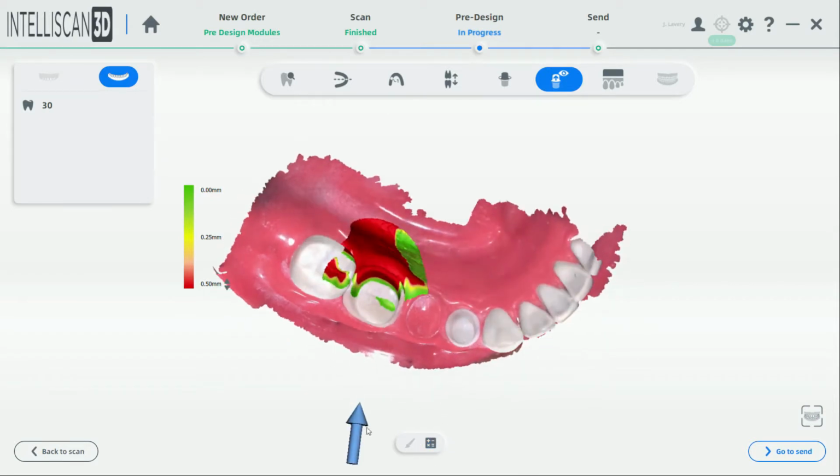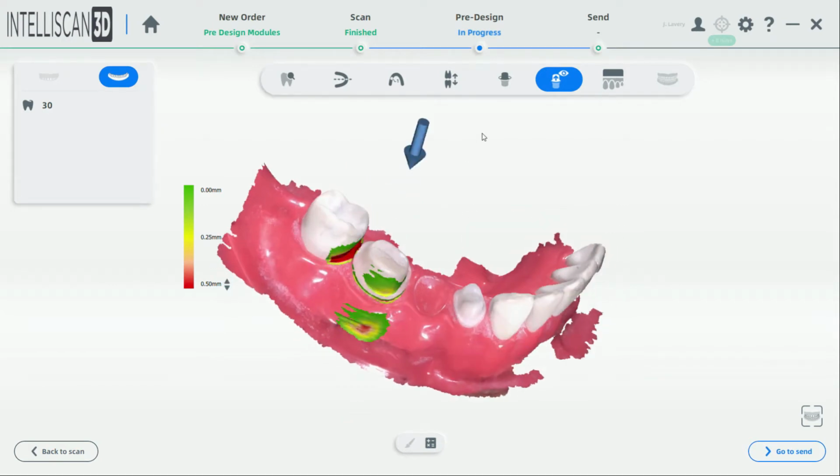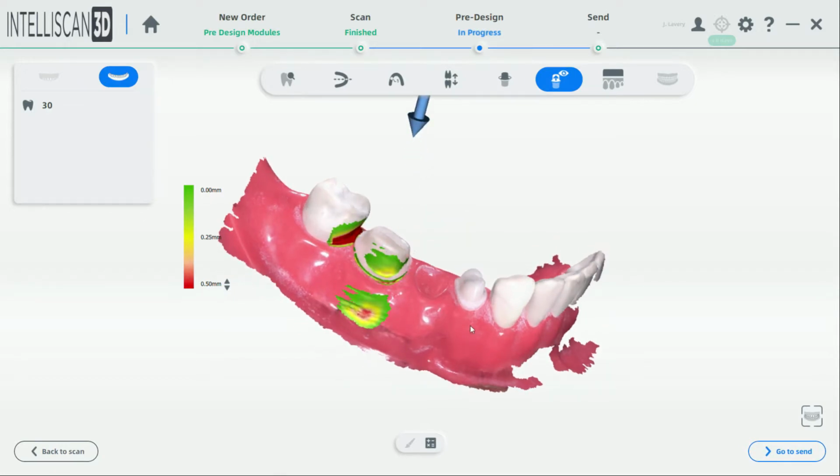but you do want to make sure that you double click right on the occlusal to position your pin directly from the occlusal. And as a reminder, if you do have to adjust the occlusion because there wasn't enough reduction or any areas that have too deep of an undercut, it is advised to go ahead and re-prep, rescan, and do a new bite scan.